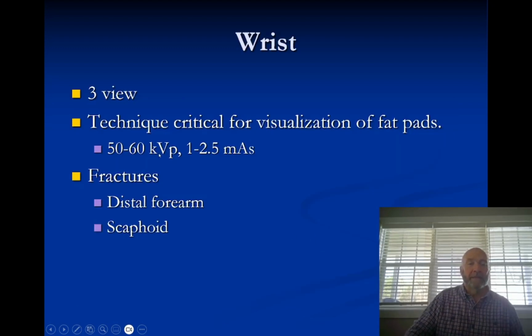So with a wrist, again, we've got a number of different views. We're going to focus primarily on 3, but I am going to talk about some other ones as well. Ignore this. This is old.